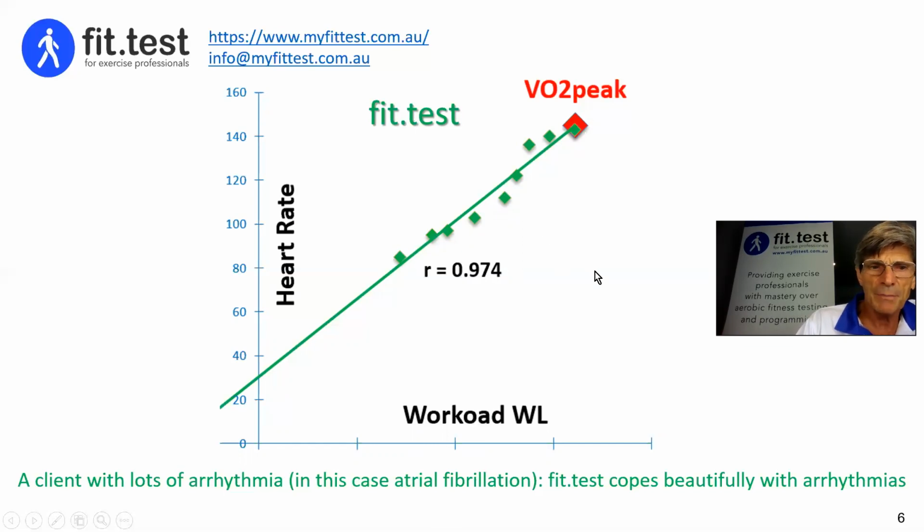Now, as I said at the beginning of this video, I certainly wouldn't prescribe exercise for this individual using heart rates because there would be far too much error. But fit.test copes beautifully with this because you have many other options for prescribing exercise that are not based on heart rates, and that's what I would do in this case.